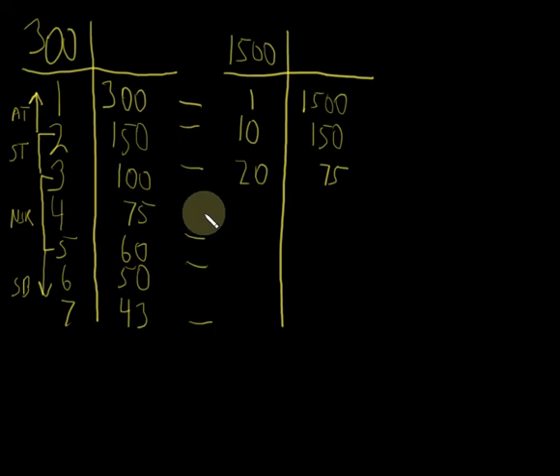So there's another method that's used sometimes called the triplicate method. The triplicate method just means that we do the same thing, but we triple everything. So we take 900 divided by the number of large blocks between 3 beats. So I start at 1 beat, then I count out to the next beat, and the next beat. So I start at the first beat, skip the second and third, and then go to that third beat that follows. So in other words, it's really the 4th beat on there. I can get a better approximation because that accounts for some of that irregularity. Even that's not that perfect.